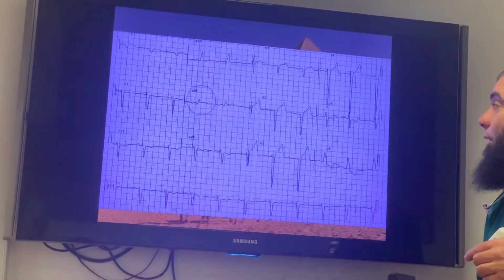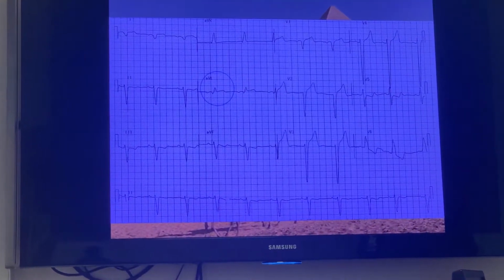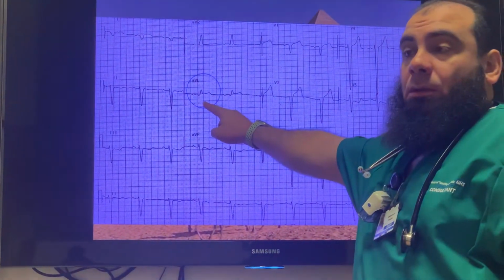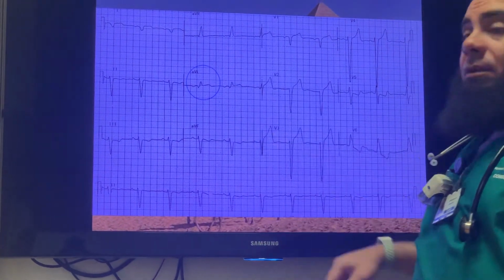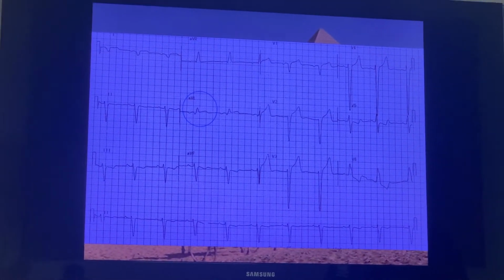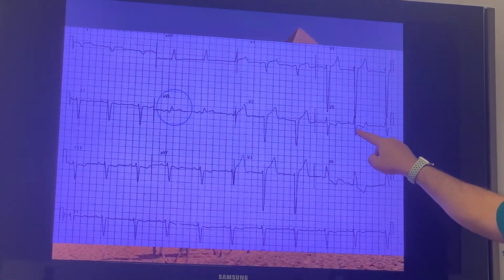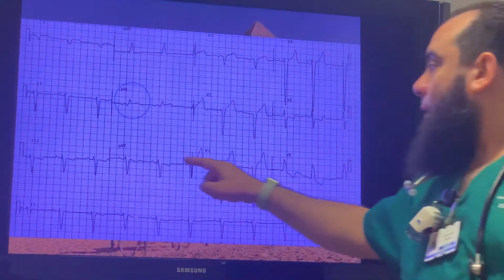These are some ECG changes for left bundle, posted as Sgarbossa. Usually, if you look at aVL, you expect ST depression in aVL with T-wave inversion, but here it is elevated. You can see it. Yes. Okay. Can you see the depression? Mm-hmm. This is positive and this is depressed. Can you see it? Yes. Okay. Can you see that?